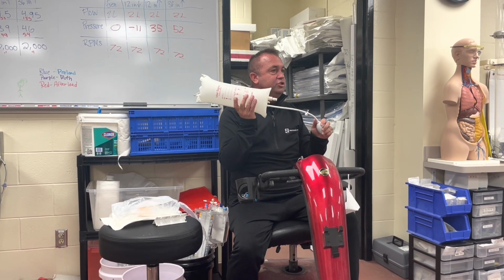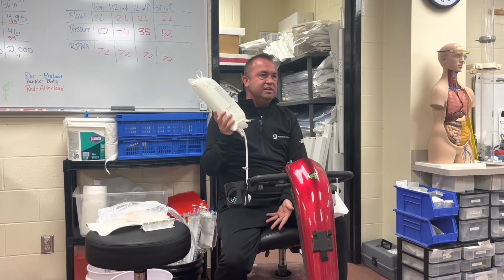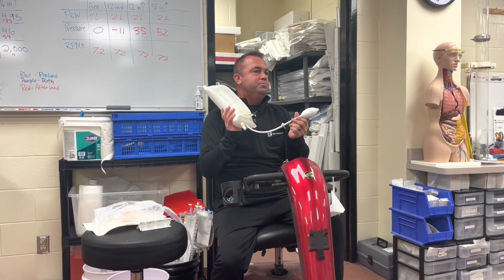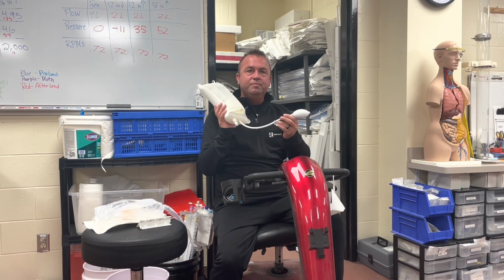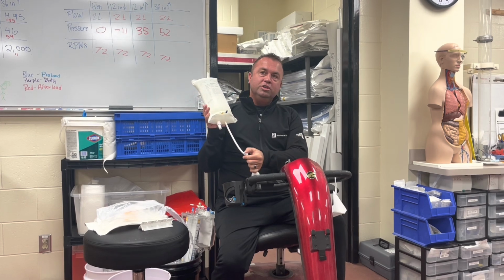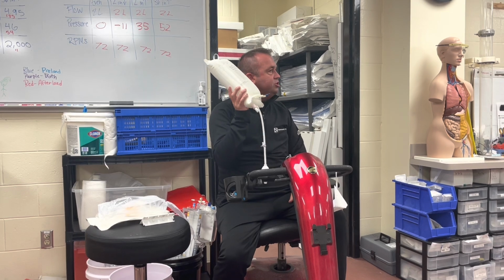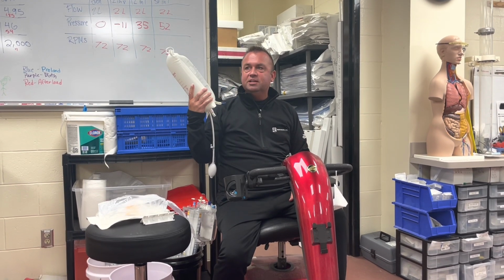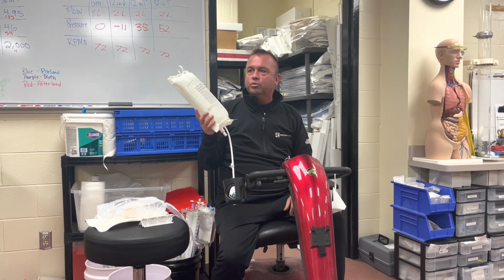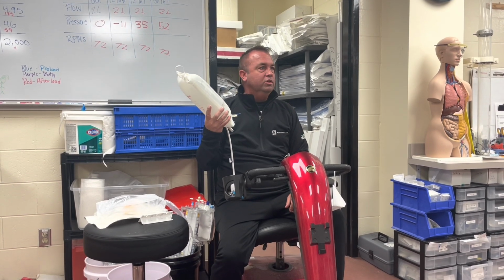Okay, here's another trick of the trade. The more these pressure bags are used, the less likely this whole thing will hold pressure over a period of time. Usually, it's in this bulb and this part of the tubing. So what the smart thing to do is after you pressurize this, always turn the stopcock off to the bag. Now it holds that pressure and the pressure doesn't leak all the way through. Does that make sense? Pretty easy thing to do. It will just save you a lot of having to get up and go repressurize your bag over and over again as these bags get used over and over and over again.